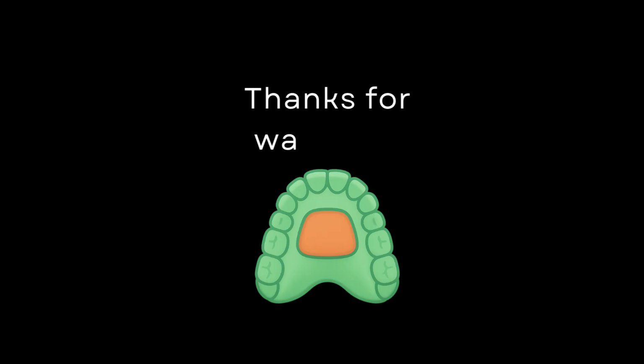So to summarize, the tooth numbers define where the patch is anchored, the ratios control its width, and the adjust values control its length. Combined, these 2 parameters give you full control over the butterfly patch on any intraoral scan.